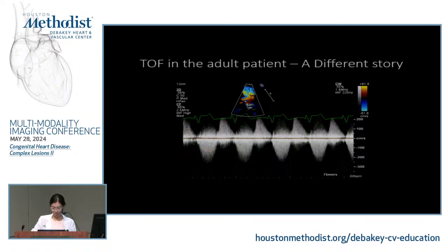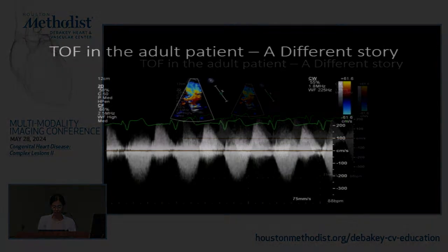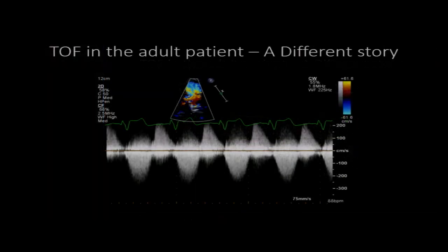Any features here that tell you this is severe? Flow starting to come back as it's going forward. The densities are similar going forward. The densities are similar, I love it. Yes, I usually get that one last. Great. So this is forward flow and this is backward flow, and you can see that the backward flow is pretty dense. The regurgitant is as dense as the forward flow. What else?